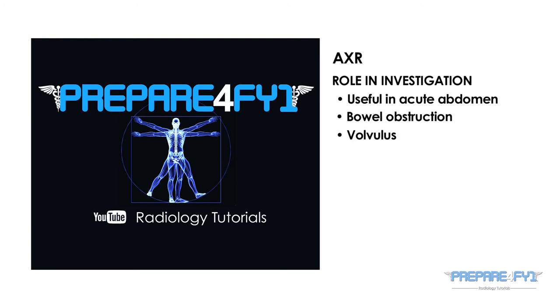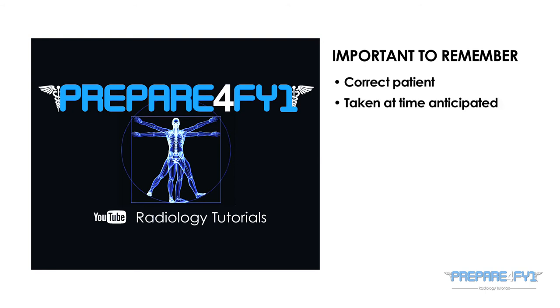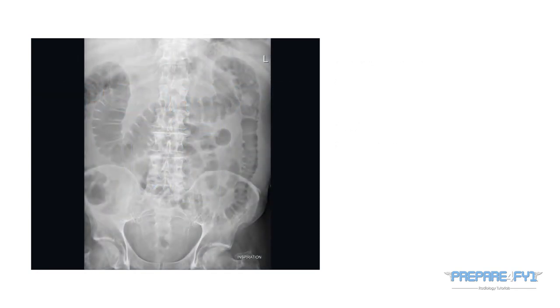obstruction, volvulus, and calculi. Before you consider any radiograph, it is important to ensure that it is of the correct patient and taken at the time you anticipated. You should also ensure that it is orientated correctly with the left side on the right side of the screen as you view it. Abdominal X-rays are generally supine, but may also be lateral, erect, and decubitus. Let us now consider the film.